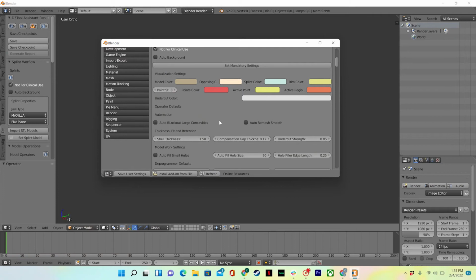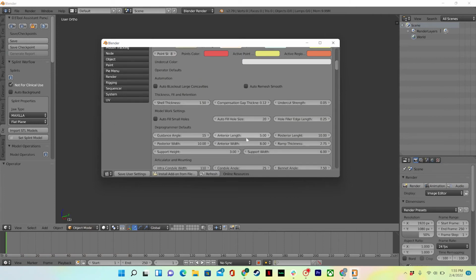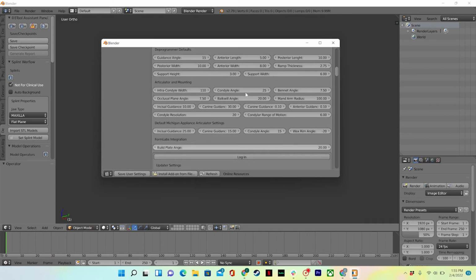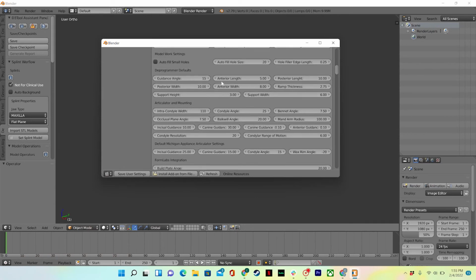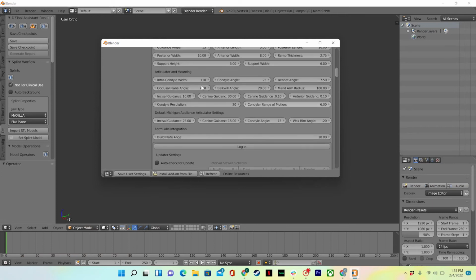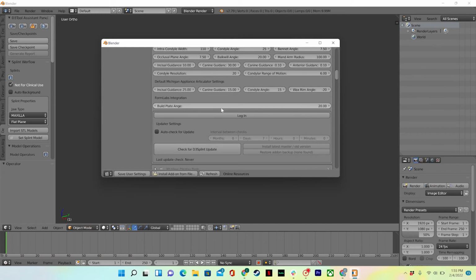And you can also come in here as you get used to using the software and find most of our default values, for example, all of the articulator values and all of our other preset values, that you can then change and save as your default, so you can have your own values set as the default. And this is also where you will go to update.